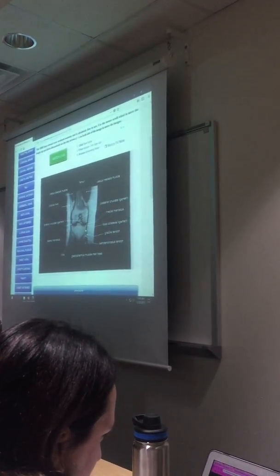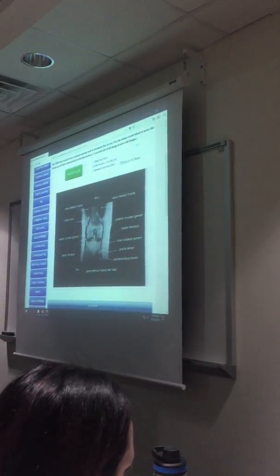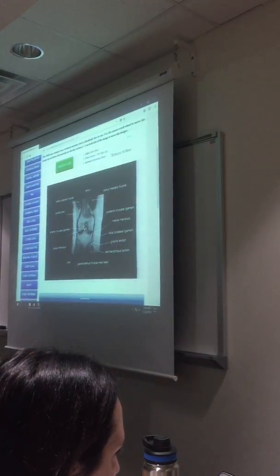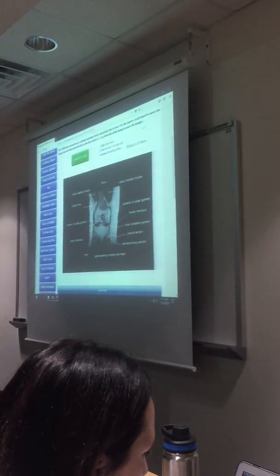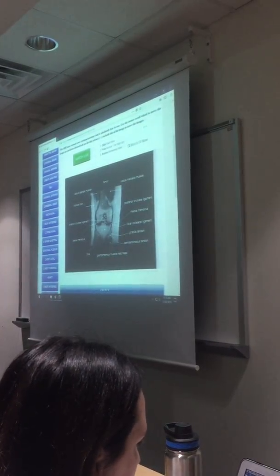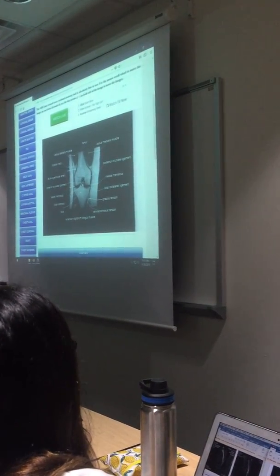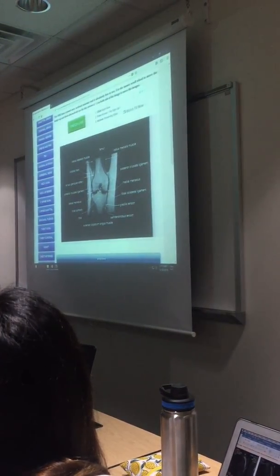In MRI, when you're looking at the femur bone as it makes up the knee joint, notice this makes a tunnel. Can you kind of visualize that there's an x-ray that we take that we call the tunnel view? It's really where this ACL and PCL cross. When you see the structure that attaches here to this tibial plateau, the tendon that comes straight down, because we are now looking straight on at the knee in a coronal plane.